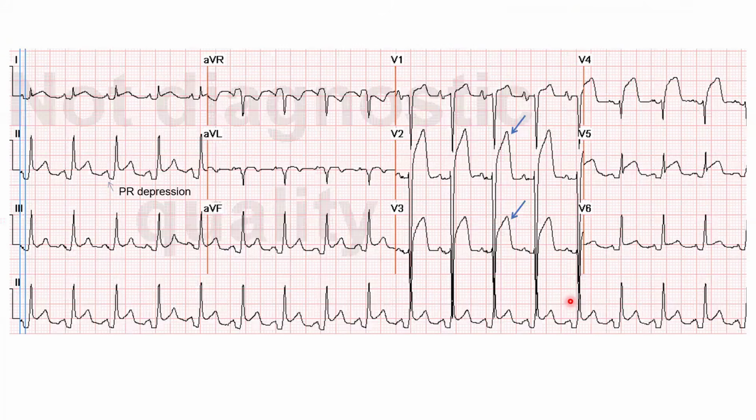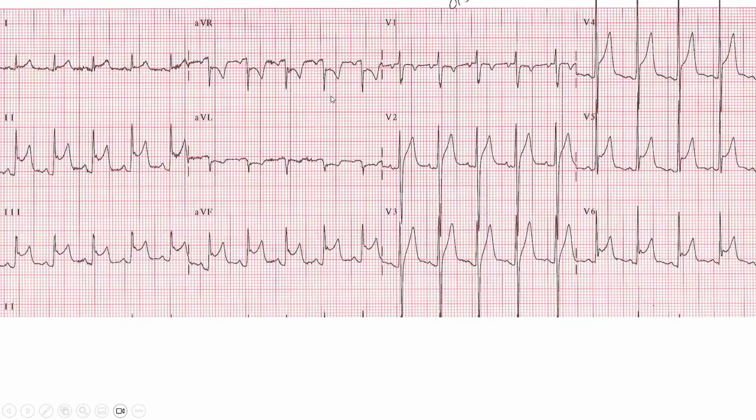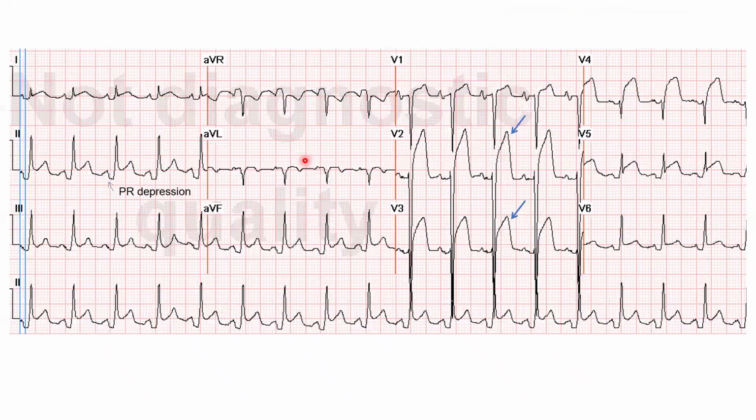This is another patient, a cancer patient with dyspnea. She has diffuse ST elevation in all the leads with ST depression in aVR, like the prior patient. So this may initially suggest malignant pericarditis. You also have PR depression in leads II, aVF, and V5, V6. However, having a pericarditis feature does not necessarily rule out STEMI. One should search for the 5 STEMI features and make sure none of them is present.